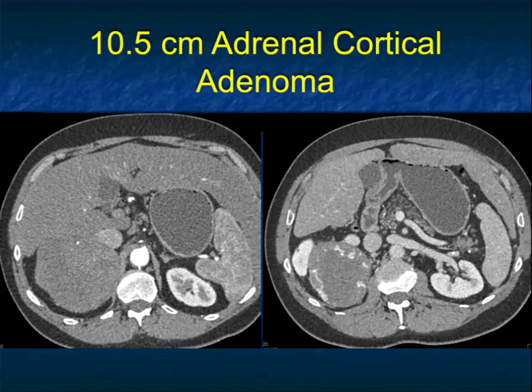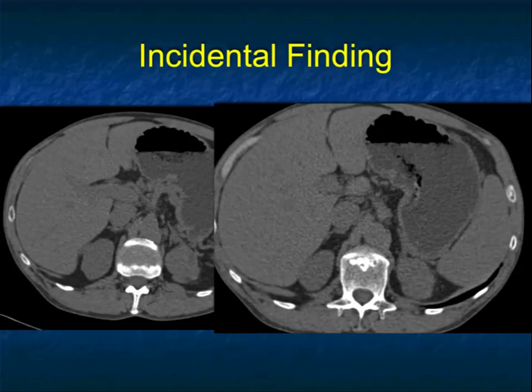Again, I would have thought about carcinoma, there's no doubt. This is probably the biggest adenoma I think I've seen, but just a really good teaching case. What it really teaches me is that this case going forward, I still would not have called it an adenoma. You just can't do that.